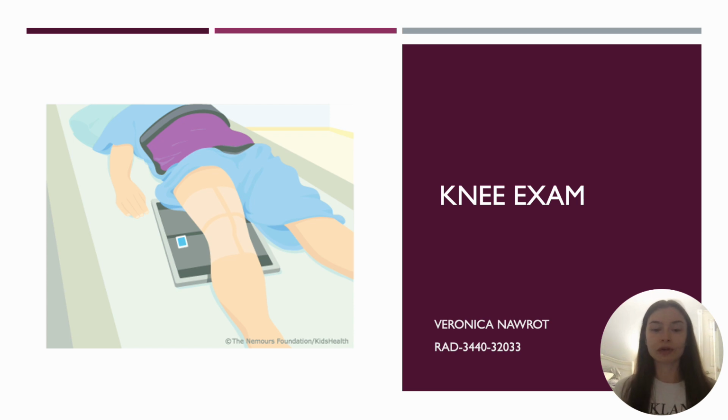Hi everyone, it's Veronica. So today I'm going to be presenting about the image evaluation criteria for the routine X-ray exam of the knee.